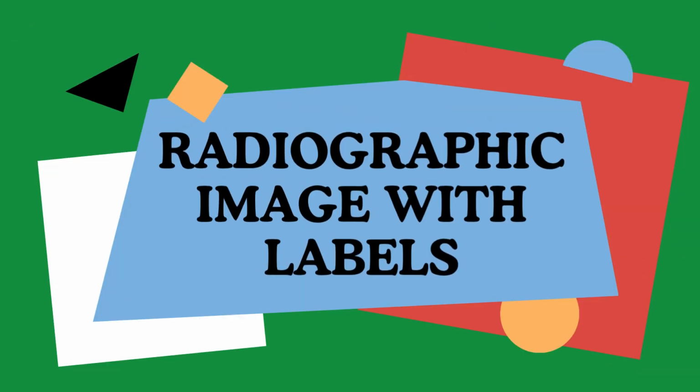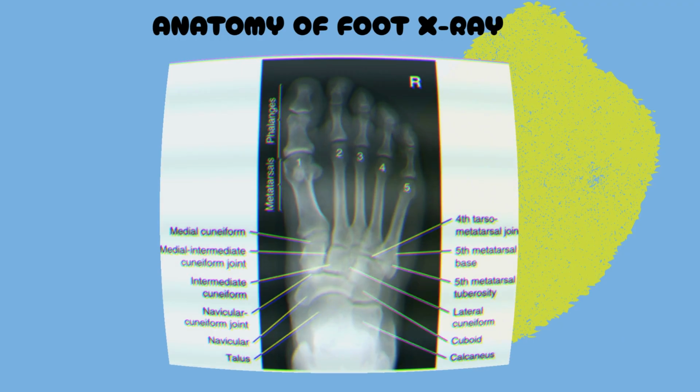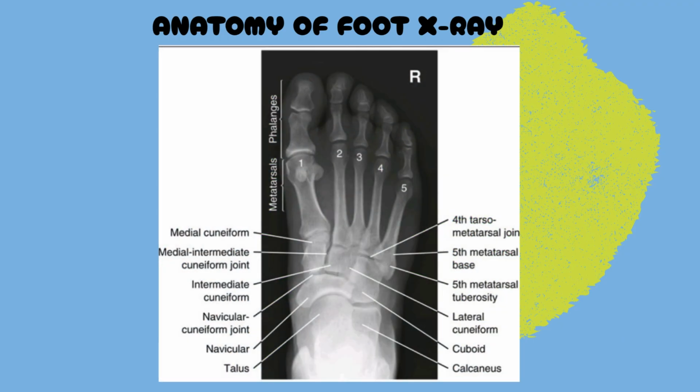Now I will explain about radiographic image with labels of AP foot X-ray. As a radiographer, we need to know the anatomy of foot X-ray. By knowing the anatomy, we can decide whether our radiographs are good or not.